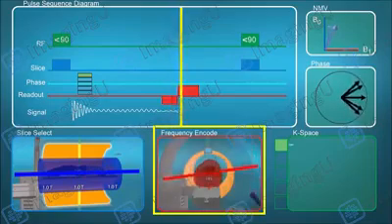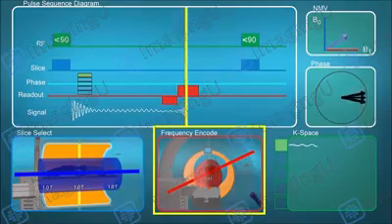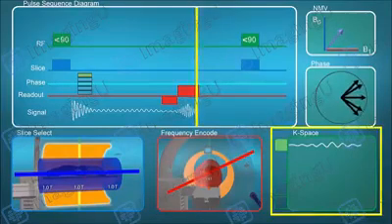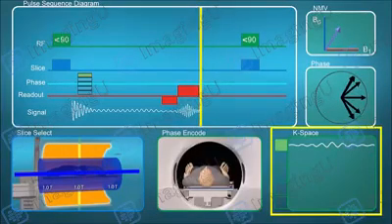The MRI signal is recorded in K-space during frequency encoding, which is left to right. The phase encoding gradients determine what line of K-space we will be recording from top to bottom.